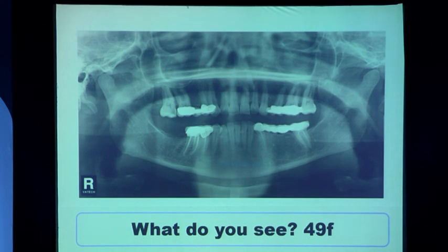Yeah. It is normal, but the only thing is it has an accessory foramen in front of the external acoustic meatus. This is not common. This is a variance. There is the presence of an additional neurovascular bundle in front of the external acoustic meatus. This can be attributed to the most possible causes of pain, swelling, metastasis of the infection into the middle ear, and also this is the hyoid, this is the styloid bone, yeah?